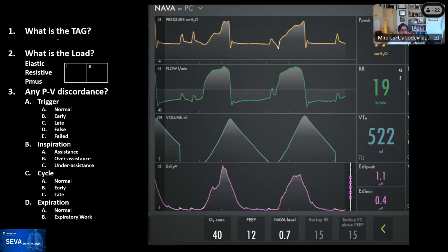So everybody has put here PC-CSVr, and just for the sake of making this clear, we're saying that the mode is pressure control, and we understand that the majority of us, when we think about pressure control, the ventilators usually control pressure by creating a square waveform. So when the breath starts and then it ends, they're trying to create a square waveform.